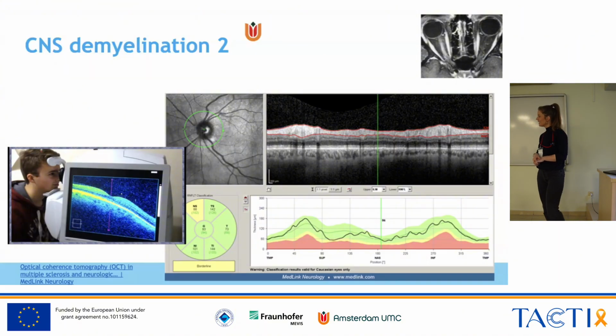Eva, I have a question. Are we expecting the optic nerve thickness to be the same throughout, or is it supposed to show this wiggly behavior? Yeah, part of the wiggly behavior is normal because of the vessels. You can see them here. And also there are differences in thickness based on the area. I think it was temporal, that you can see temporal thinning.